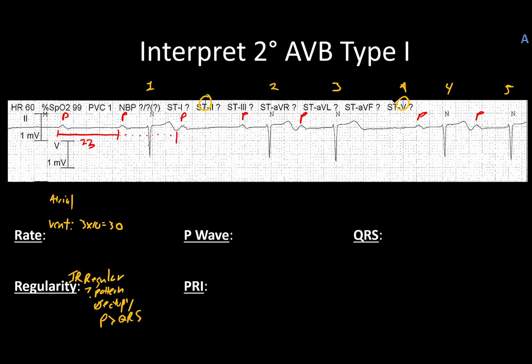This one, that is 22. And this one here is another 22.